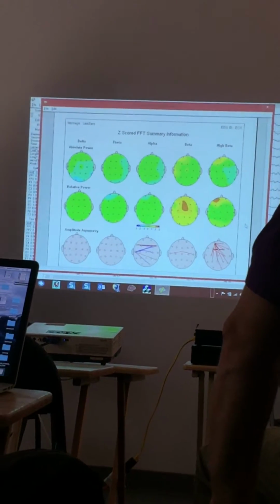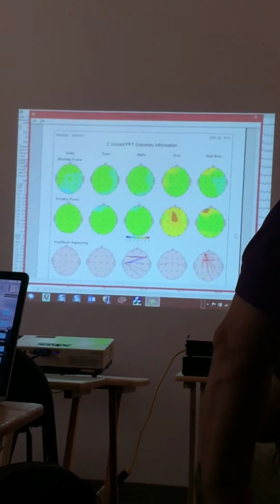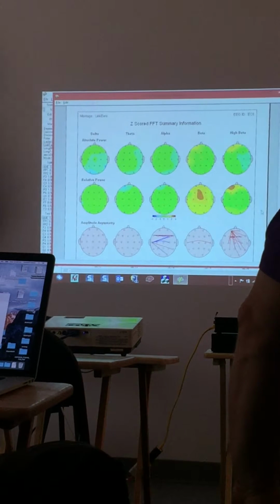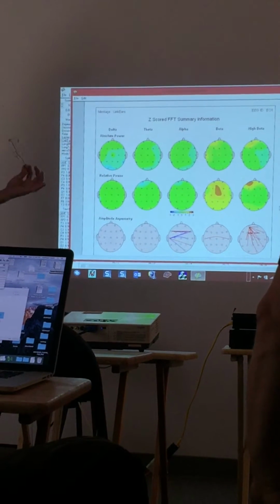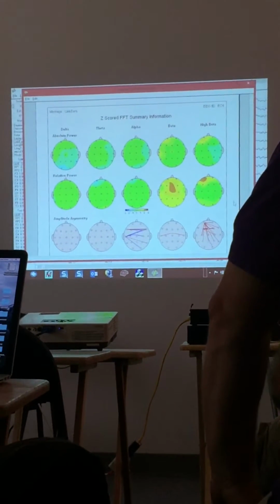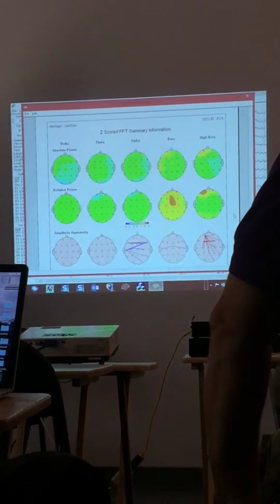See, here's the rub. The brain is a multidimensional compensatory mechanism that has billions of connections. Okay? In one area, we're measuring it from 2 different perspectives. So we have to be real careful on saying this is a balanced brain or an unbalanced brain. We're going to keep an open mind on how we actually look at that. Now, if everything is green, then it's suggestive of being balanced. But I've seen people where we've restored them to that norm, and they still didn't get better.